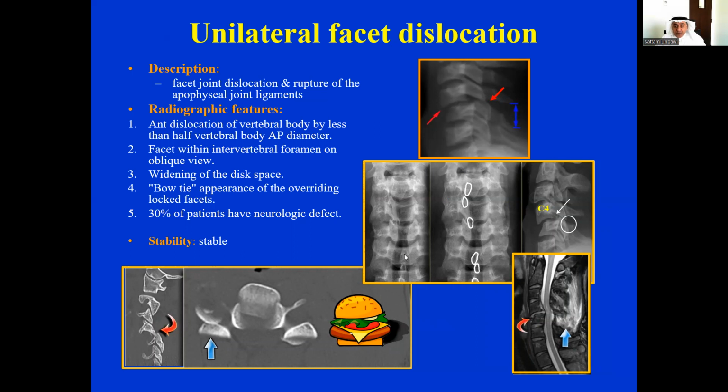Look at the spinous processes in here that suddenly swing this way before it comes back to the center. So that's malalignment. And again, this is the uncoverage of the facet and the anterior translation, less than 50% anterior translation of the vertebra above to the vertebra below. Obviously, this will compromise the spinal canal and impinge on the spinal cord, resulting in cord edema and impingement.